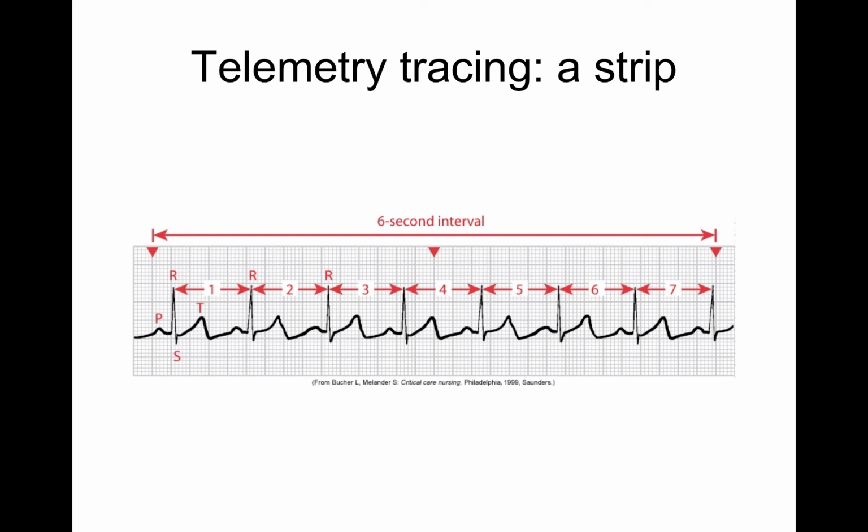So when you're looking at an EKG strip, you actually want to have 2, 3 hash marks. So you want to have 3 seconds there, 3 seconds before. And so when we're looking at an EKG, we're going to identify different things that we're going to go over in the next couple slides that will help us take a view of what's going on in the heart. To identify the rate, what we're going to do is count what we call the R waves. And so you're just going to count and multiply it, since it's a 6-second strip and you want to do it per minute.